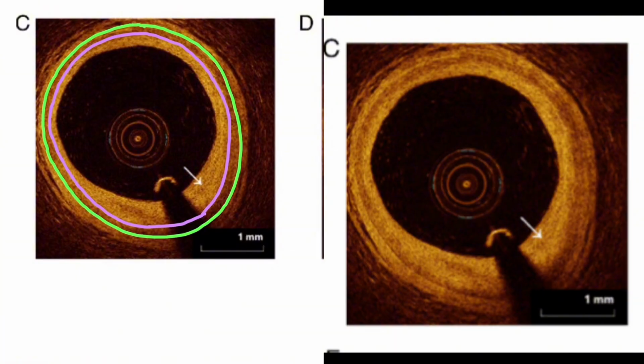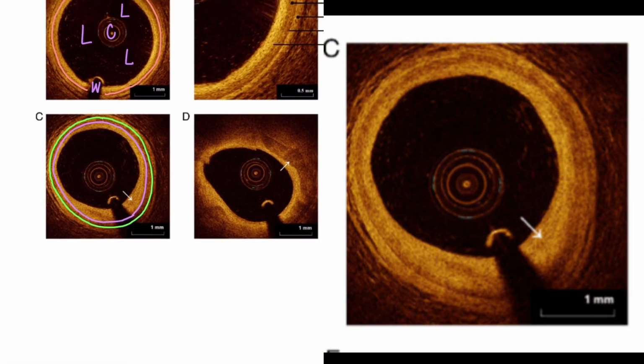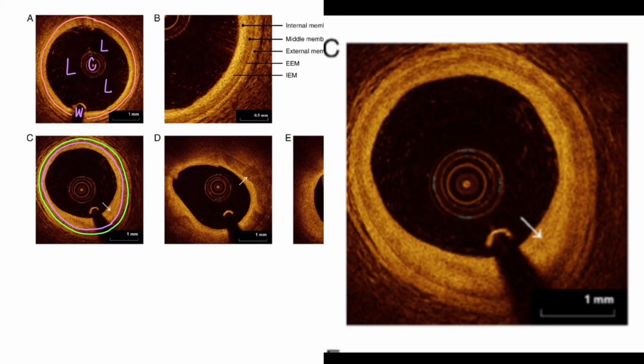That would actually be out to the green for your stent sizing. So that's why it's important to understand that, so you're measuring accurately. I know it does it automatically, but you can move the markers. You just want to make sure it's the right place, especially if you have a really thick media. It could be a millimeter of difference, which does make a difference as far as diameter. So keep that in mind.